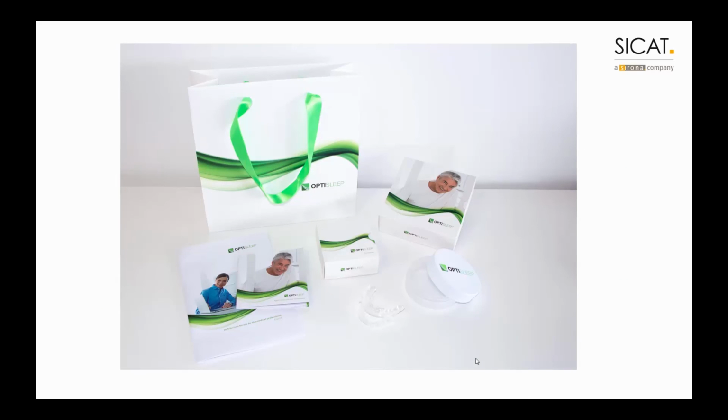That's how the OptiSleep comes in a box here, with a patient brochure, how to take care of the OptiSleep appliance, with a doctor's brochure, and with the little connectors here in the box. We would recommend that you, as the doctor, keep the connectors, and you will be the person who is interchanging if necessary. So, and that's basically it.